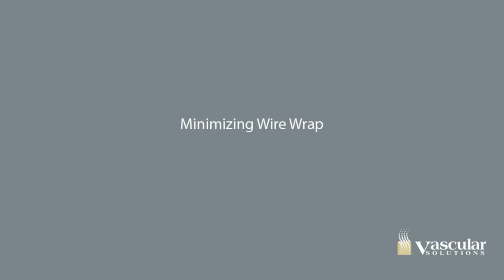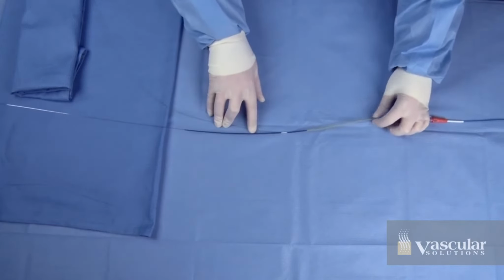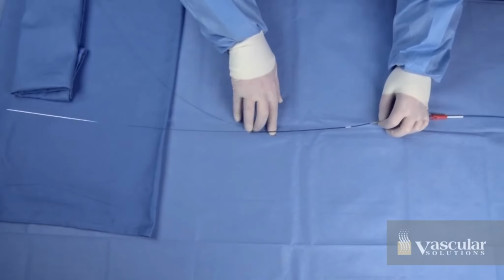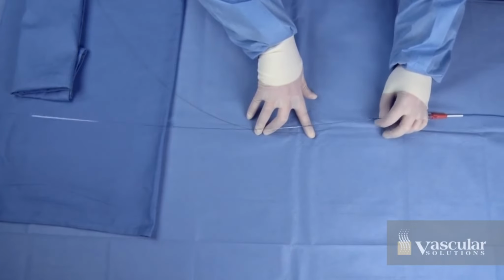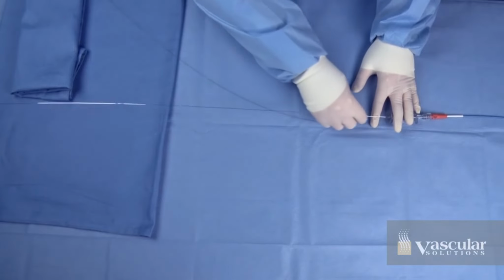As a rapid exchange device, there is potential for wire wrap to occur when using the GuideLiner catheter. Wire wrap can interfere with the GuideLiner's ability to deliver interventional devices. A towel can be used to minimize the potential for wire wrap when using the GuideLiner catheter.